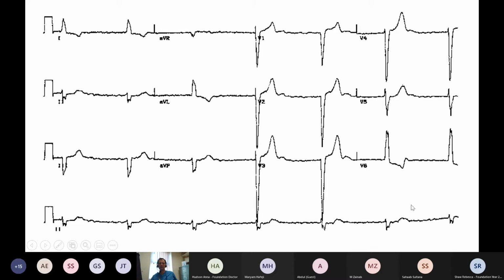How does it show left ventricular hypertrophy? As soon as your ECG complexes are invading their neighbors, there is LVH present, and you can see this is invading nearest neighbor. There are 1,000 different ways of quantifying LVH on a 12-lead ECG, and all of them get defeated by patient's habitus being challenging. But here you've got some very deep S waves. So this is LVH.